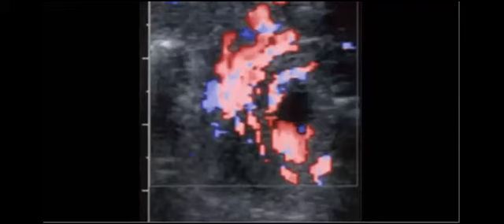Okay, so these are the three most common appearances that they can show you in the exam: either a single bubble with some distal faint gas, or it can show you the corkscrew sign with the duodenum and the duodenojejunal flexure on the right side, and finally the whirlpool sign, which is the reversal between the superior mesenteric artery and superior mesenteric vein. Okay.